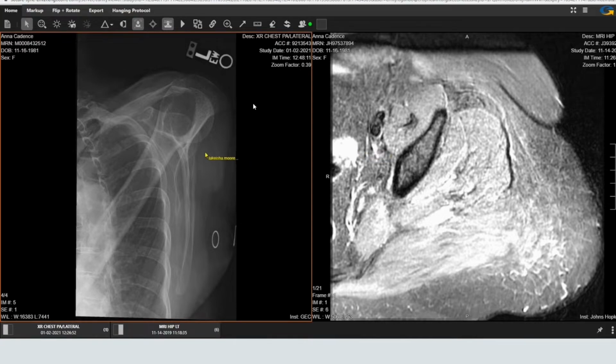If you and your colleague are in 2 different places and need to review the same image, you can both toggle this button and will now see each other's movements on this page. Here I am, and as you can see, here's my colleague, if we need to make reference to anything in this image in order to plan for our patient's care.